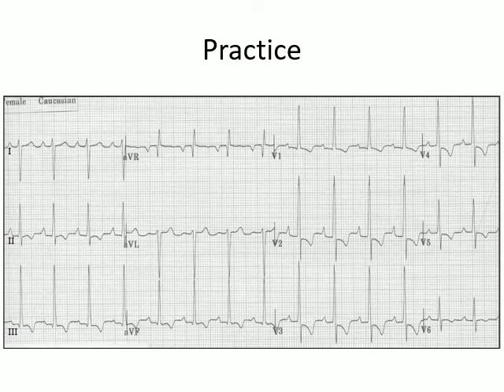Now let's move on to the next ECG. Just looking at it, you can say that something's not right. Let's figure out what it is. Approaching it in our traditional way, let's see what we can say about the rate. This is the first R wave, say, and this is 300, this is 150, and this is 100. You can say that the heart rate is slightly more than 100, that is, the patient is having tachycardia.